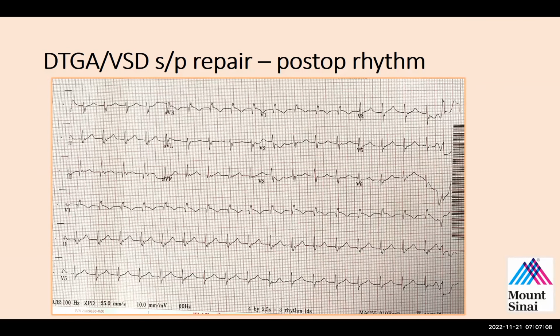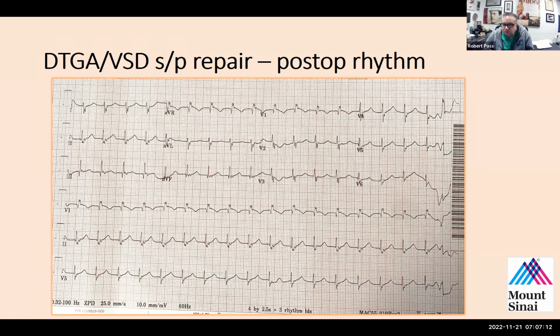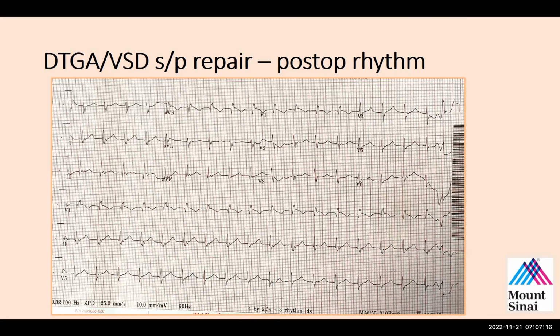So this rhythm, I don't think it looks sinus. So I think probably it's junctional rhythm, going by the rate.